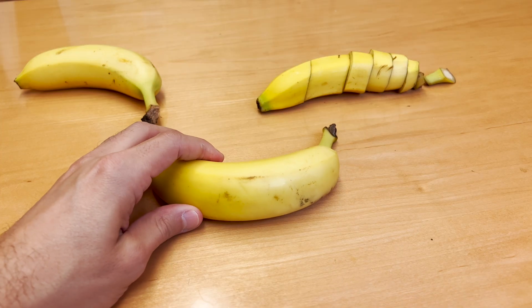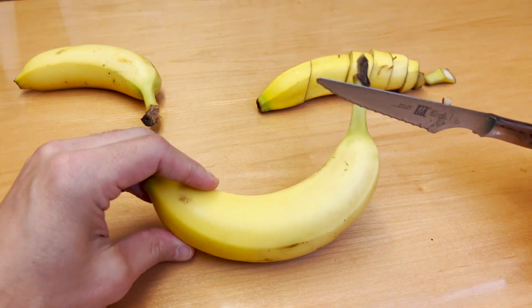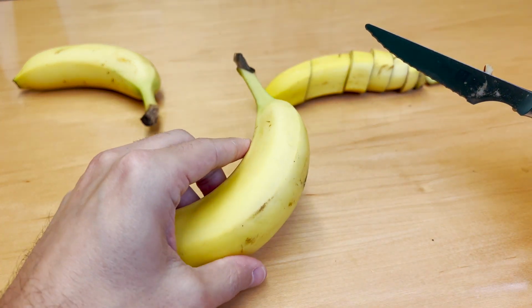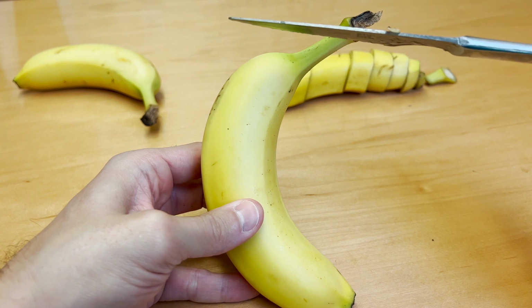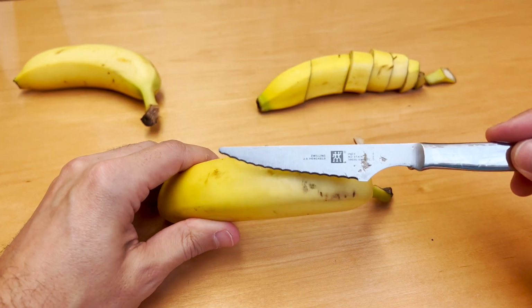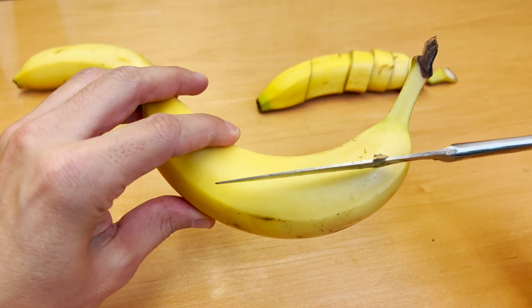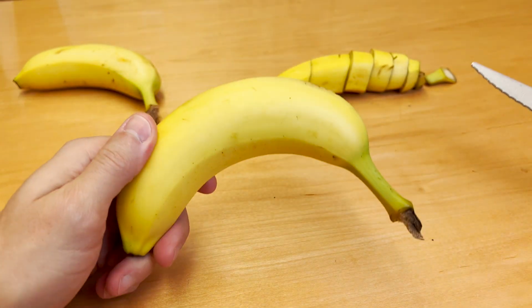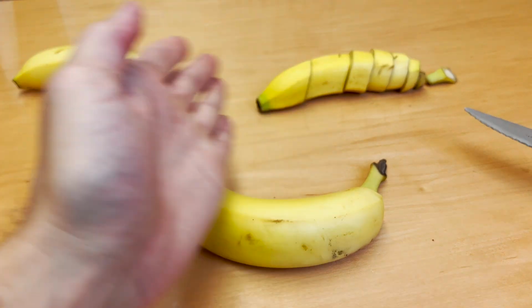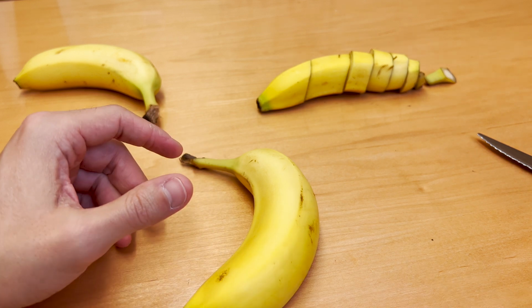Okay, so instead of making cuts through the banana like we did up on this one, we're going to change the cross-sectional cut from cutting like this. We're going to orient the banana differently, and we're going to make some cross sections actually through it, cutting like this. And this will demonstrate how the cross section changes based off of the orientation of the cut through the object. So back to our laser.